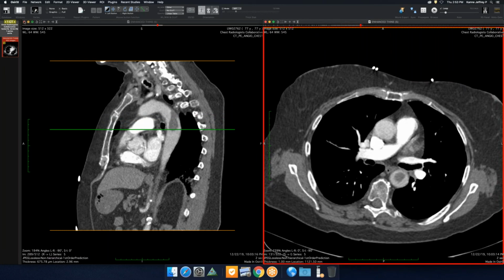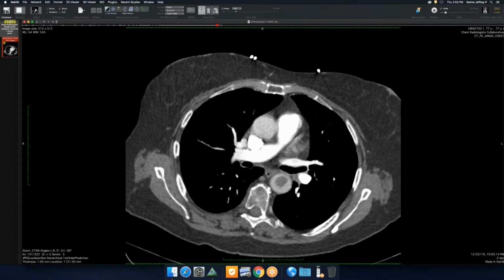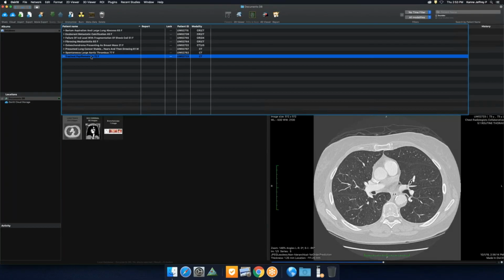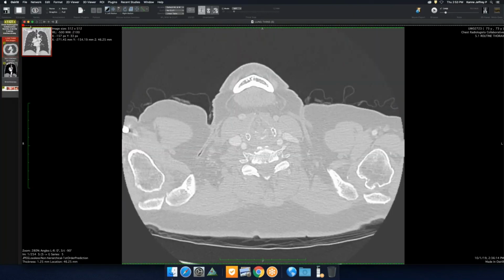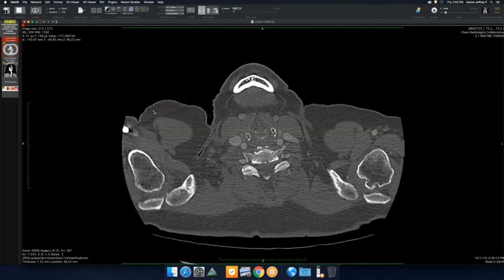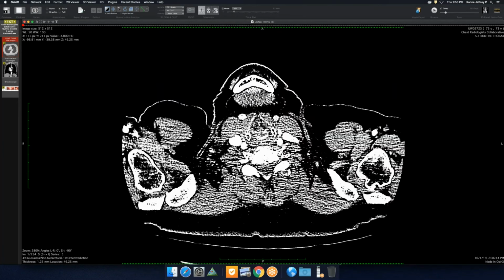So that was kind of just weird and kind of cool at the same time. All right, and then just one last one. It's just a nice example. I have bronch pictures. This is a 73-year-old who I came across because she had a bronch. Let's see, let me get the right windows here.